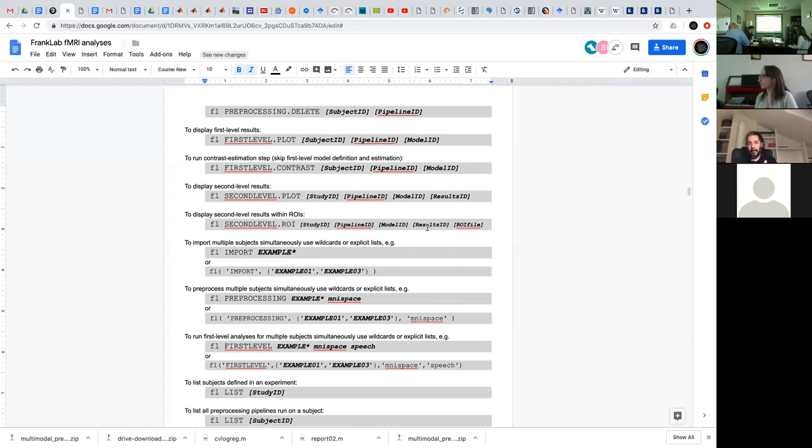And you're going to do the aggregation as taking the average across all of the voxels within the ROI. But in some cases, for example where you want probabilistic ROIs, you don't want to do the aggregation like taking the average. You want to do something like a weighted average. And the underlying scripts that are actually run are able to use these weighted averages instead of just raw averages.